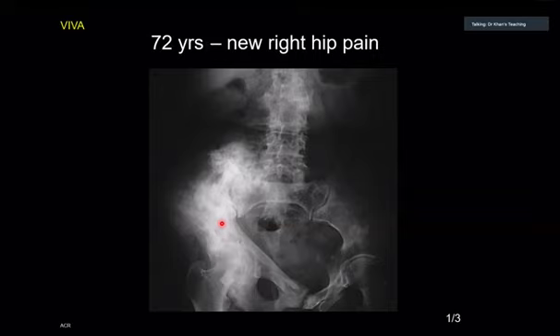There is a bit of sclerosis, etc. You are not very sure what is happening here, though the film quality is poor, it is from literature. But having said that, look at this spine. This is L5. Why is there bone here? There should not be any bone here. And what does it tell you?